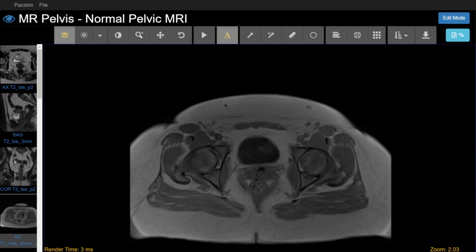But there are many tissues that do not behave this way, and we need to be able to characterize those tissues when we see them. So we need to know the things that are T1 hyperintense, like fat, certain types of blood, and mucin, and things that are T2 dark. Most importantly for pelvic MRI, fibrotic tissue and chronic blood products.